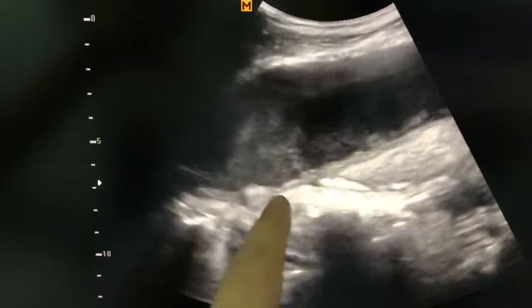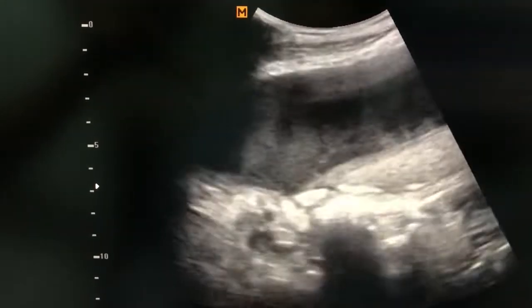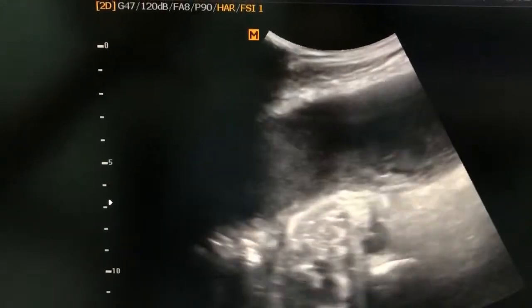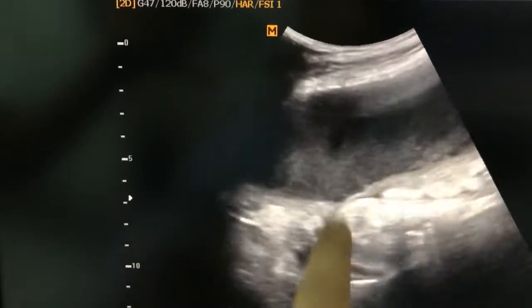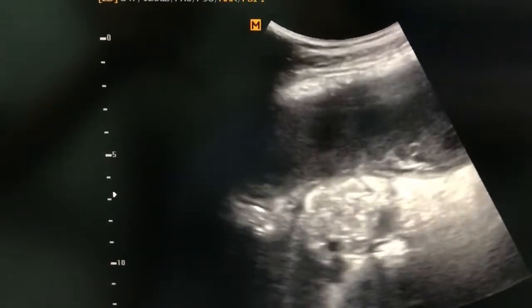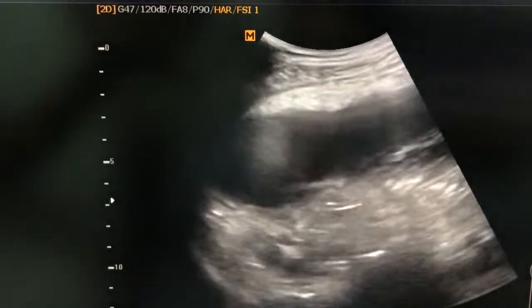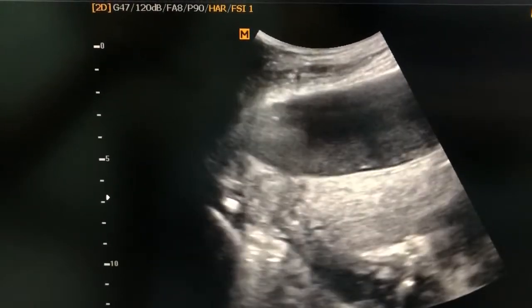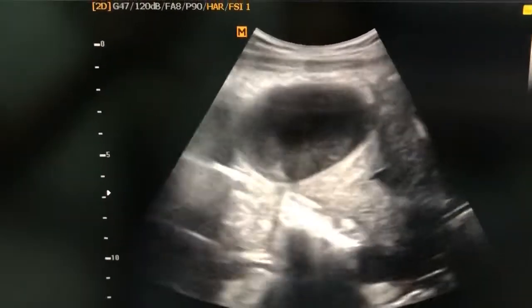This is not the endometriotic cyst, I tell you, because this is the 5th or 6th case which I had taken the follow-up after post-operative finding, and this kind of fluid texture came to be the blood collection, oozing secondary to torsion.